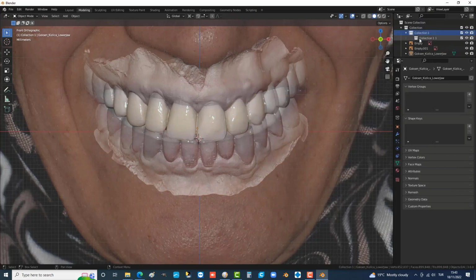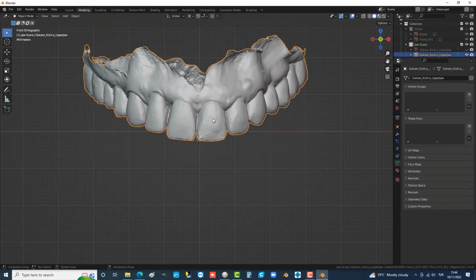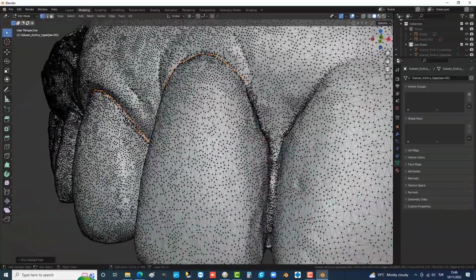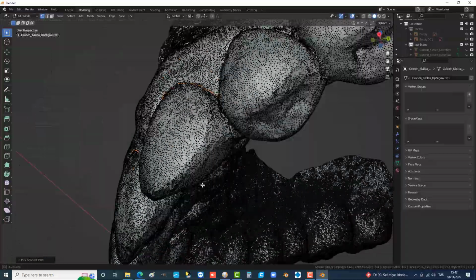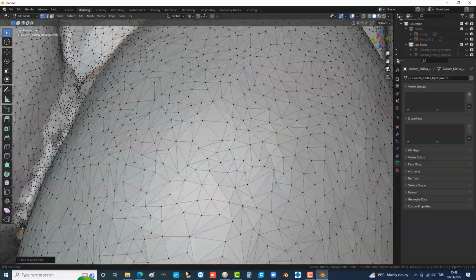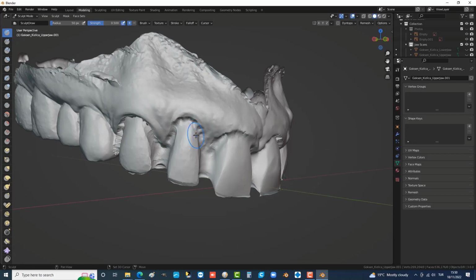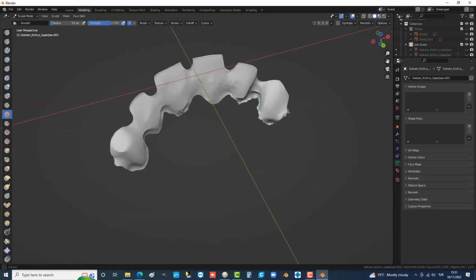Sometimes removing existing crowns or bridges is impossible to prepare an ideal mock-up. It's easy to extract, reduce, or reform digitally. Blender software has a lot of great tools. We can select a certain area, delete, fill, or edit using Blender's tools. Of course, we need a reference while sculpting the teeth. It's possible to add the patient's face photos and merge with STL models.